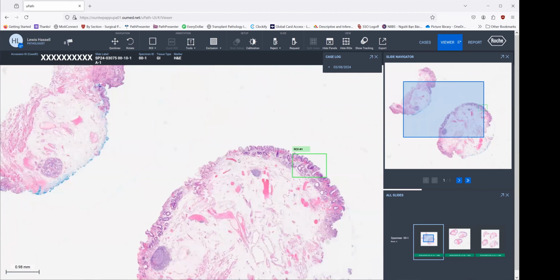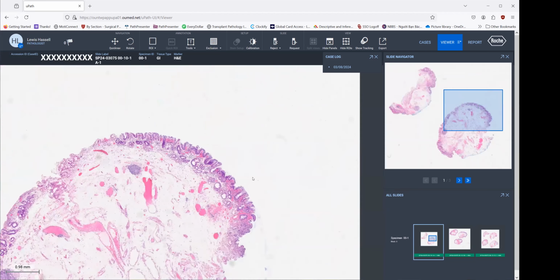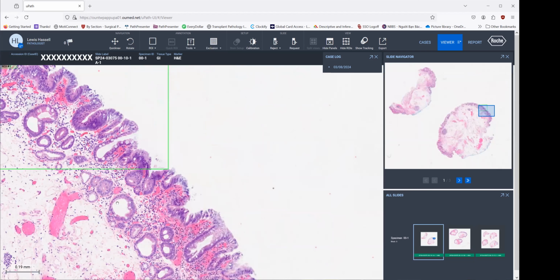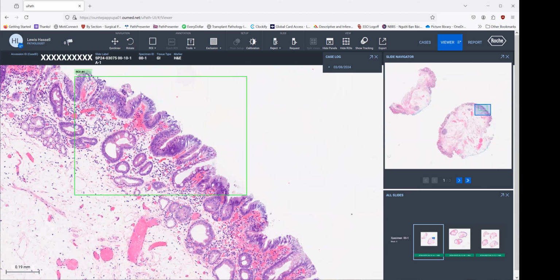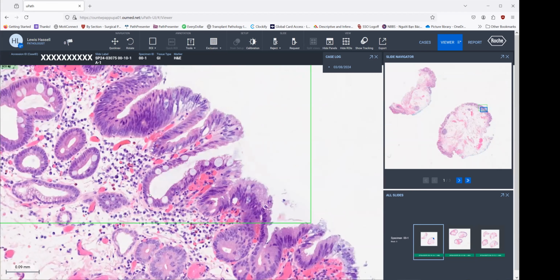So in this particular case, we don't see any excess tissue here, but you see I've highlighted an area here. Let's go down to there and take a look, because I think right here we have the beginnings of low-grade dysplasia. So here's a fairly normal, if you will, intestinal metaplasia.